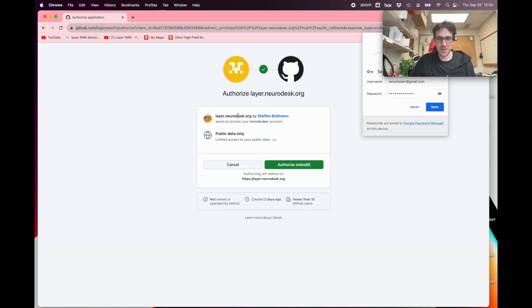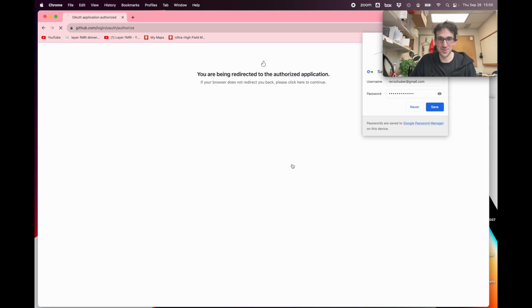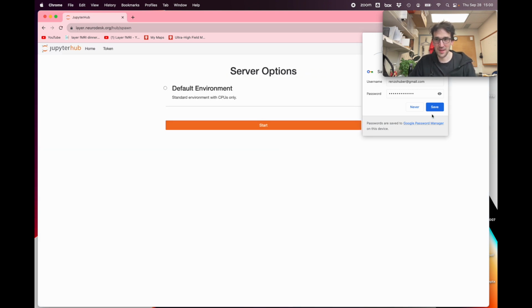And I will give Steffen Bollmann the authority to read my GitHub profile. And I don't need this. I will use the default environment and can start it.